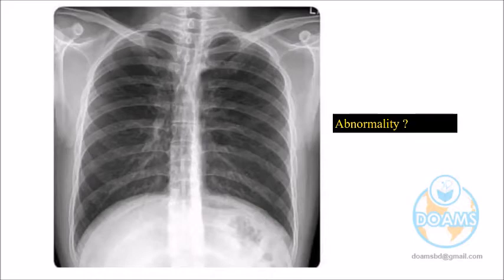Lips clear. No, I'm just asking simple observation, not detail. Nobody getting anything to say. Position not AB. Very critically, is there any heart at all? Yes, no, heart. Dr. Rashid, be confident. Is there any heart? No. So it will be the gross observation.